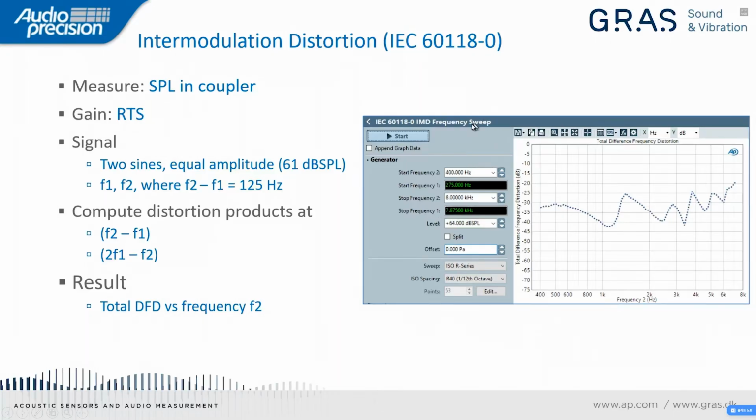Just like the ANSI test, we have a special measurement in the APX software that we've just added called the IEC 60118-0 IMD frequency sweep.